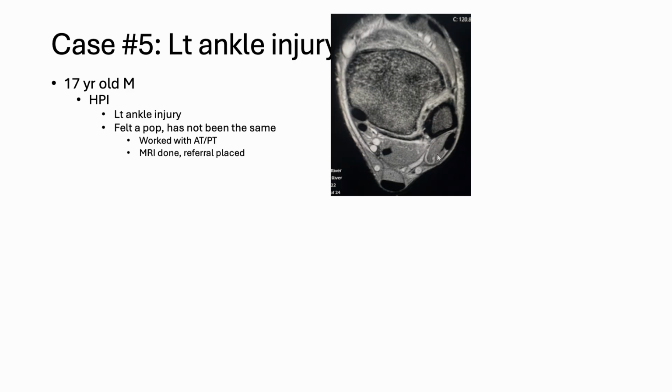Basically, this whole area doesn't look good to me. I don't see a good ligament at the syndesmosis. The posterior looks okay, but the interosseous doesn't look normal in my opinion. I didn't like the way it looked. I don't see any major peroneal tendon issues. I wasn't super concerned about low ankle at the time.